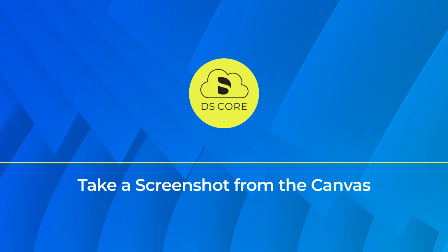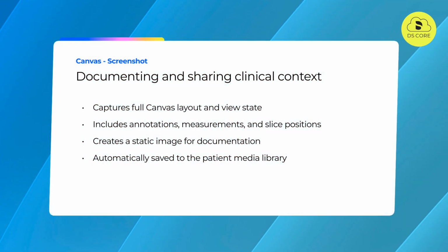The screenshot tool captures the full visible state of your canvas at the moment of clicking. This includes all loaded images, their layout and zoom level, active CBCT slice positions, any annotations such as markings, measurements, or text notes. The result is a static image, not interactive, ideal for documentation and communication.